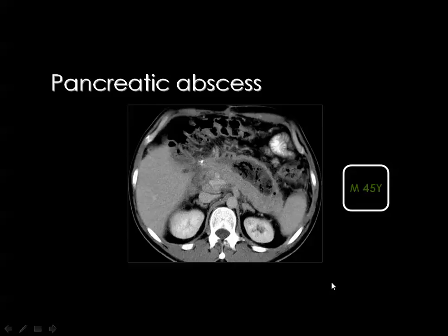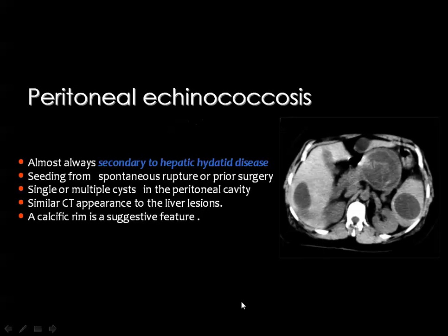Also, this air is not frequently seen inside the lesion, and if you cannot see air, you are not able to distinguish between abscess and pseudocyst in spite of the clinical data. Frequently we put a percutaneous needle or catheter in the collection and get some fluid for analysis.